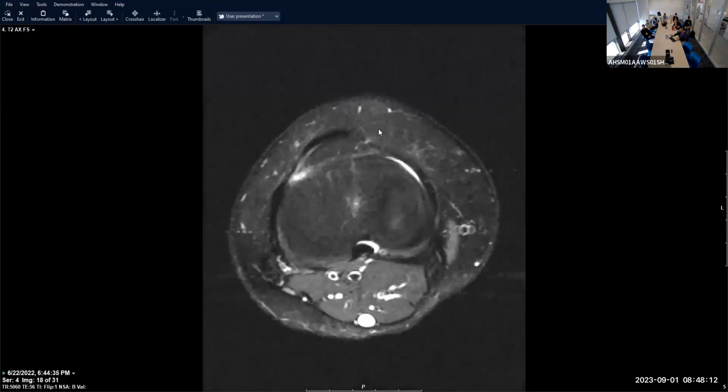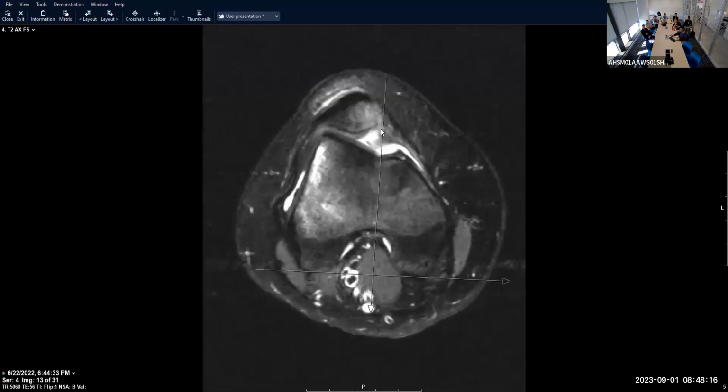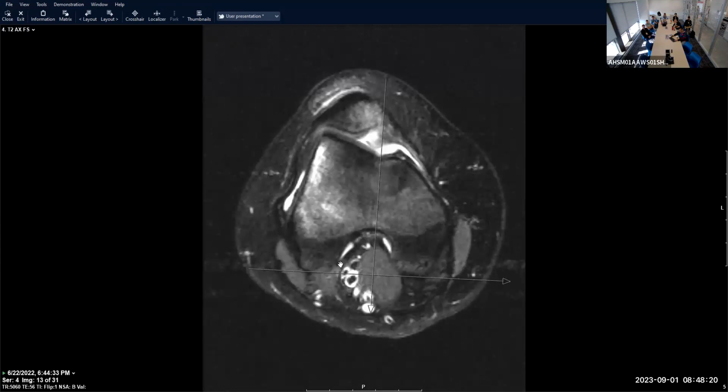So you're familiar with the tibial tuberosity-trochlear groove distance. Really how we do that is we want to find the most superior slice where we see some articular cartilage. You want to draw a line that's parallel to the posterior aspect of the femoral condyles. Then we draw a line perpendicular to that line, 90 degrees, going down the central aspect of the femoral trochlea.